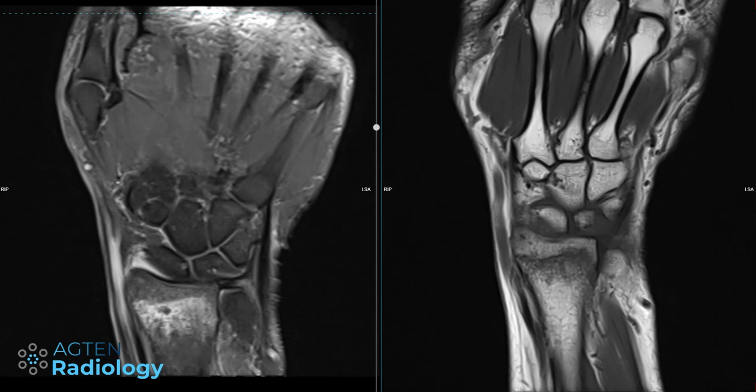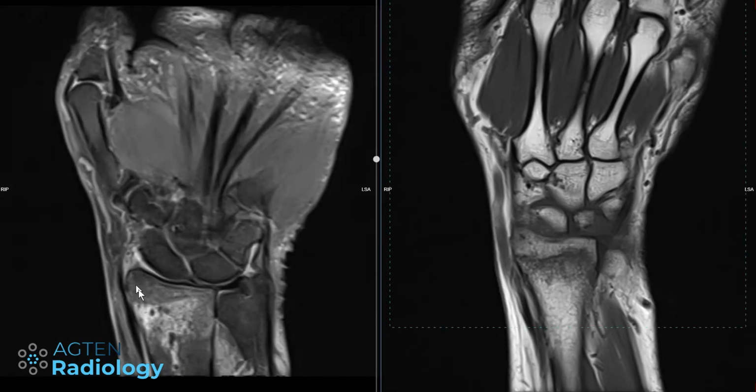In this month's Patreon exclusive video, we will have a look at a finding which is not very common, and still I've seen this a few times. Initially, when I saw it the first time, I was a little bit confused, and I did some digging and came up with this wonderful paper that we will also have a look at here. And potentially you have seen this yourself already. Now, I'm talking about this finding here.